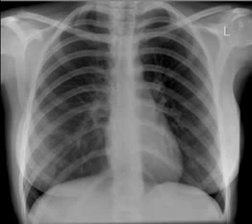Both lungs have good volume and are almost equal in size. Height of both diaphragms is at the level of the 6th anterior rib or 9th posterior rib. If there's a good breathing effort, the lung will go a bit lower. So let us count the ribs.